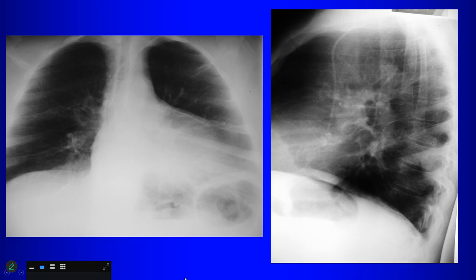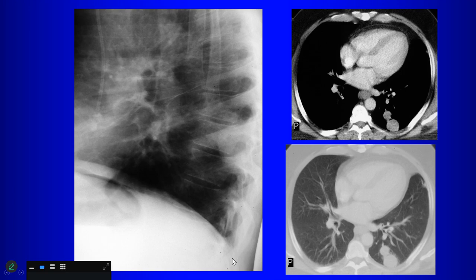This one, left lung base. Do we see anything on the lateral view? Yeah, right at the neuroforamina. You notice this neuroforamina is nice and lucent, this one is different. There's a mass here. That's cancer projecting over the neuroforamina in the left lower lobe.